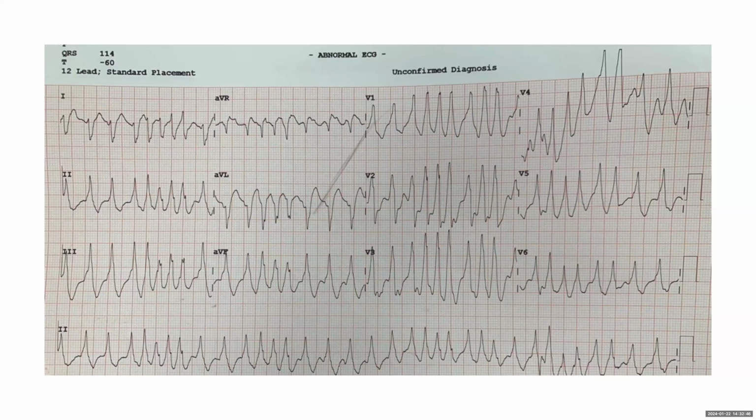Okay, just for teaching purposes, is this a high risk pathway or not, and why? Yes, Islam, correct. Why? RR less than 250. Excellent. Yeah, so you look at what's the shortest RR this pathway is able to conduct. So if it's less than 250, this is considered highest risk. Good. Excellent.